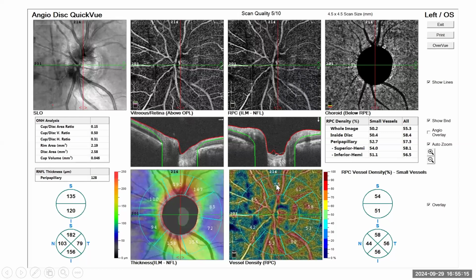Here is 55 around the superior area. This is also 61. This is superior area too. Towards these nasal parts, you have 46, and you can see some areas that are dark bluish, areas of non-perfusion at the time of image capture. The warmer areas have better perfusion. Okay, so it goes round, and this is the summary.